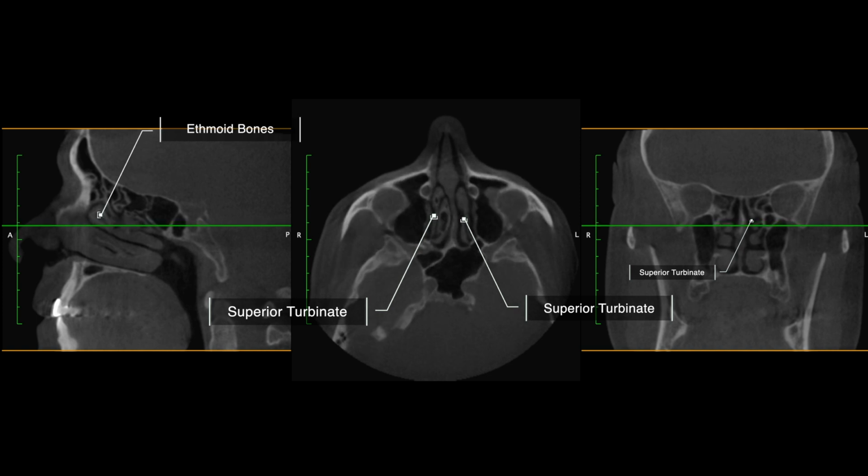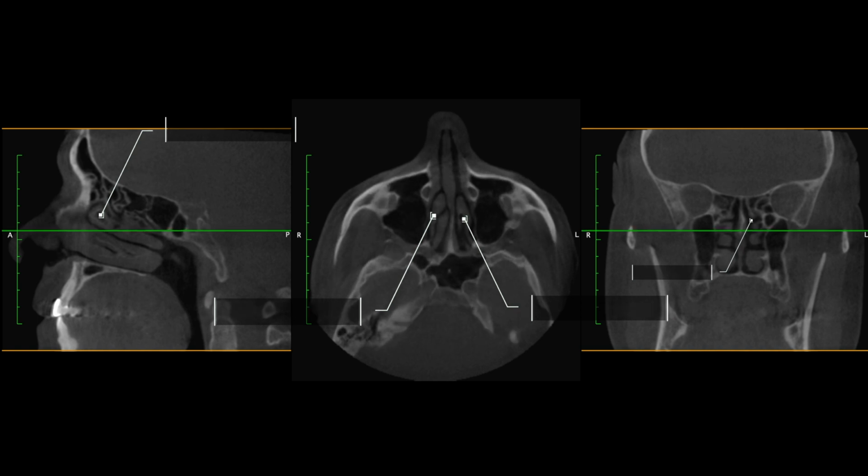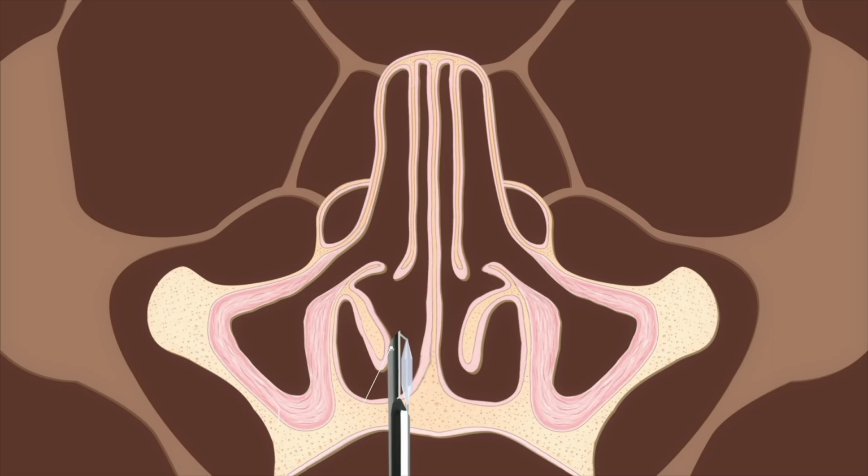The middle and superior turbinates are important because they are at the level at which it is possible to damage the eye. The ClearPath balloon protects these structures when properly utilized. Other balloon systems do not offer this level of protection.